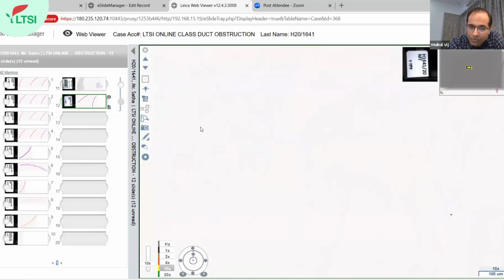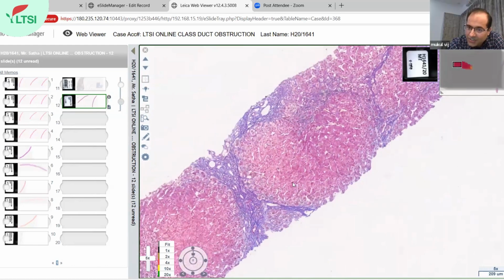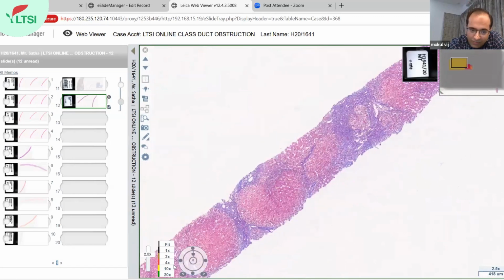This is a very beautifully done trichrome actually, and you can see micronodules already. Yes, already we can see it. So there is extensive fibrosis in this. Here we can even see a nodule formation, which confirms the trichrome stain. We go in the high power.